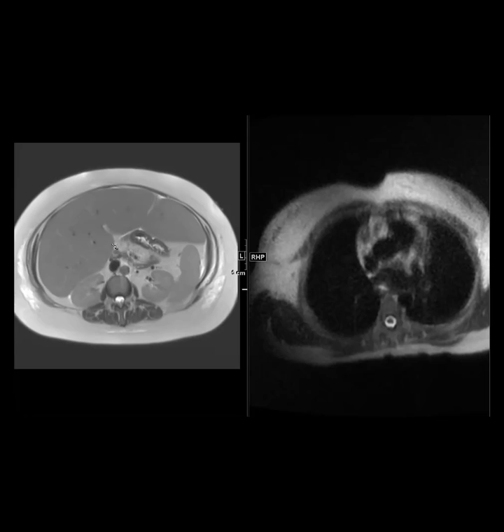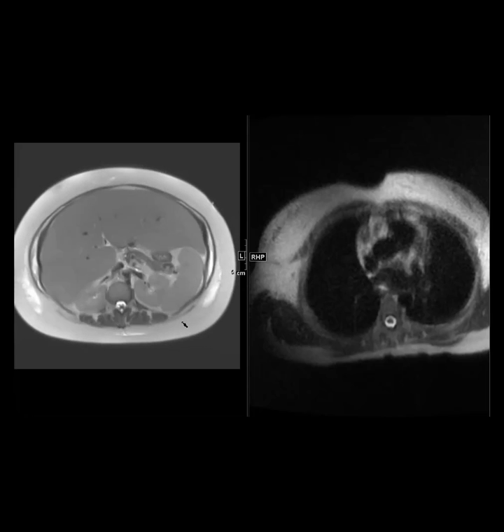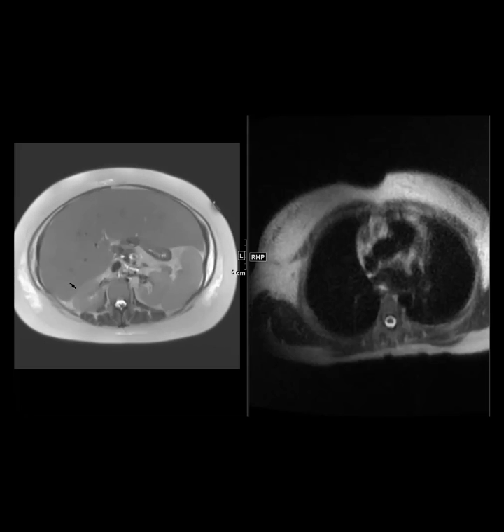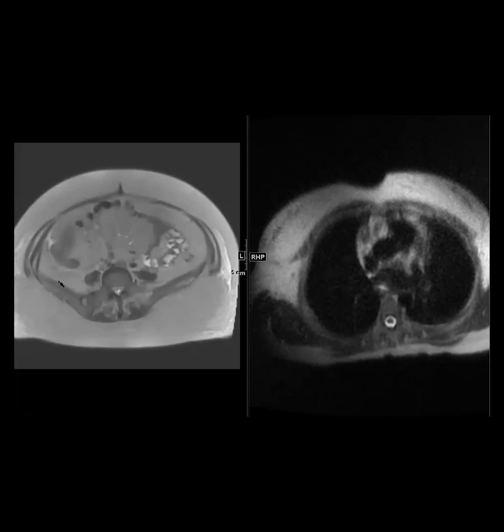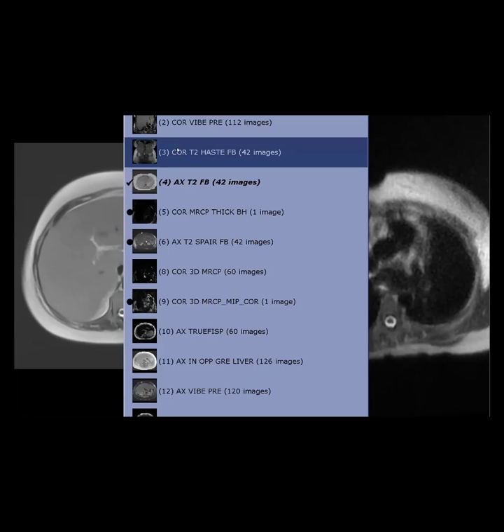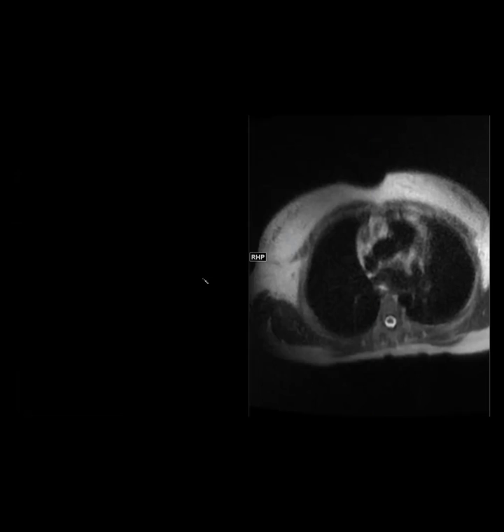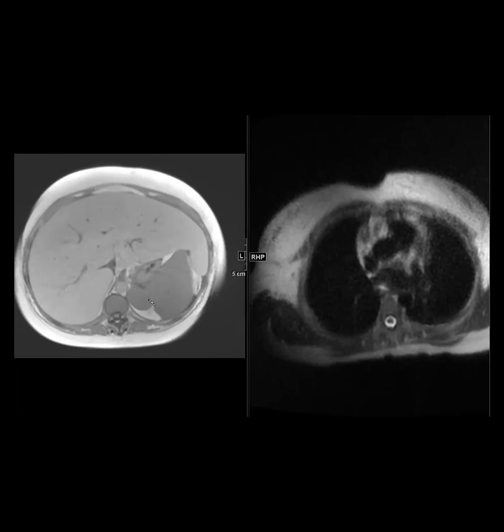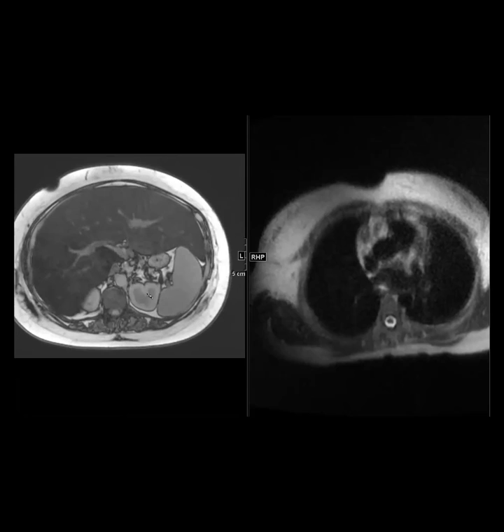Kind of interesting. And this is my last case to inspire us all. This is a patient who had hepatomegaly, and I'll show you that they have severe hepatic steatosis. You can see how big their liver is, and very fatty, in phase, out of phase.